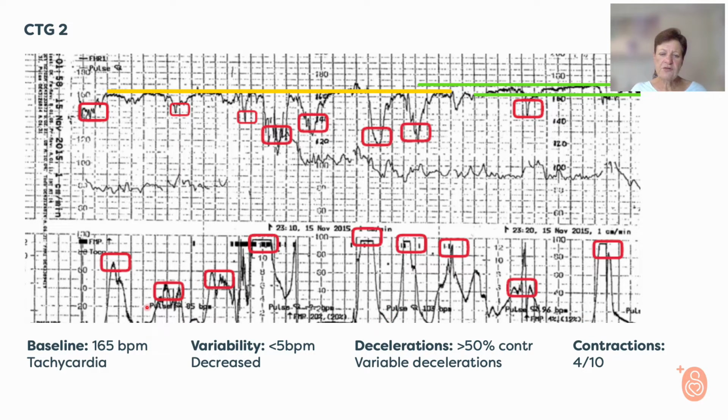And you can see these contractions are very coordinated. They are shortly on each other, so there's very little time, sometimes here for example, where the uterus really relaxes between the contractions. And even here, there's a very short period between the contractions where the uterus relaxes. There are some coupled contractions, which also causes a very small time period for the uterus to really relax.